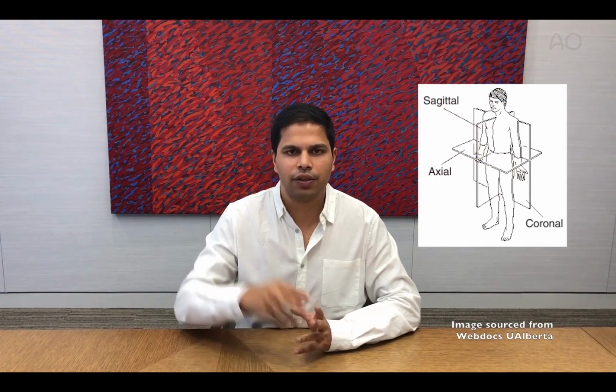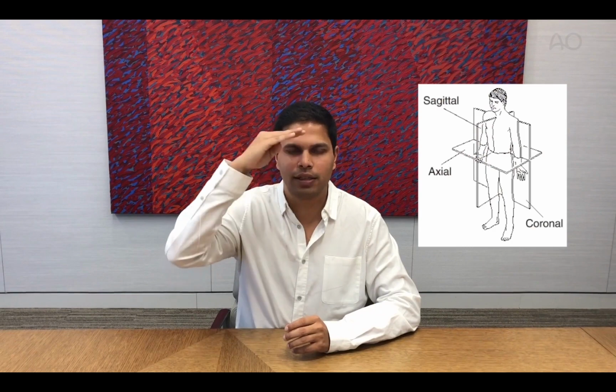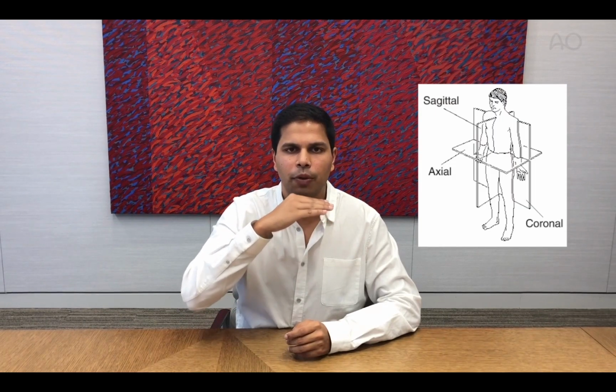It's then separated into different cuts in three views: axial, sagittal, and coronal. In an axial view, we're looking at the face from top to bottom in different cuts. This means that in the axial view, we'll start at the bottom of the face below the jaw and move upwards towards the top of the skull.